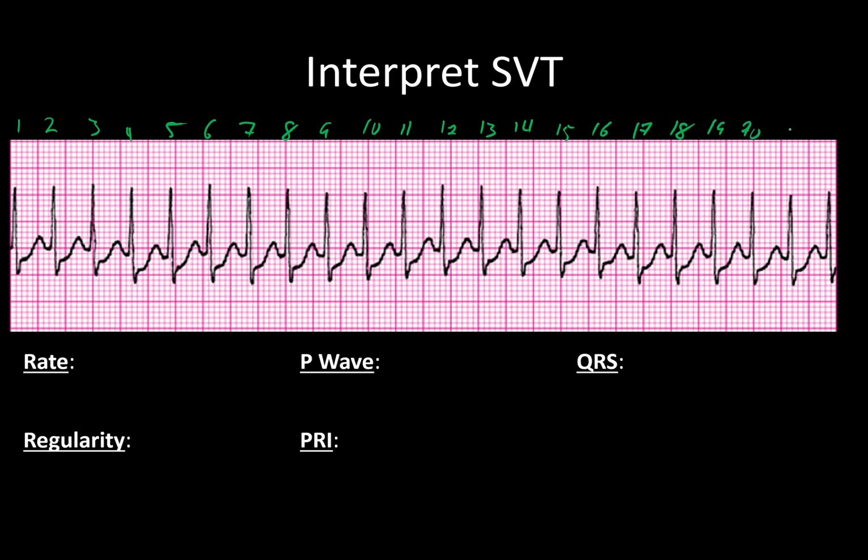But thankfully you have a fast forward function on YouTube, so you can just jump through that part. Anyway, 6 seconds long, 22 beats on this, so 22 times 10 equals a rate of 220. We are very regular. We don't have a pattern. We don't have any ectopics.